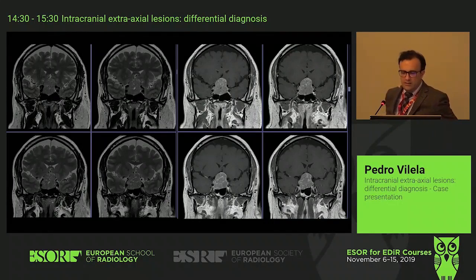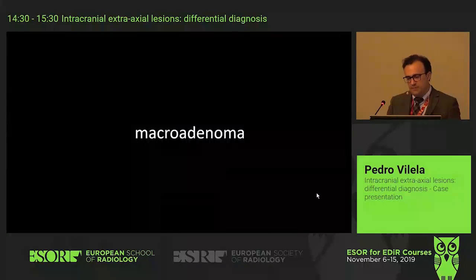Would you think that this is invading or not invading the cavernous sinus? We can look at the left and the right side and try to... Kind of at the edge from what you said before, not more than 180 degrees might just displace it. Yeah, so it might just actually be displacing. We are not sure, and there are no absolute figures on that, but probably it's just displacing the arteries, okay? And this is a crucial information to give. Okay, very good.